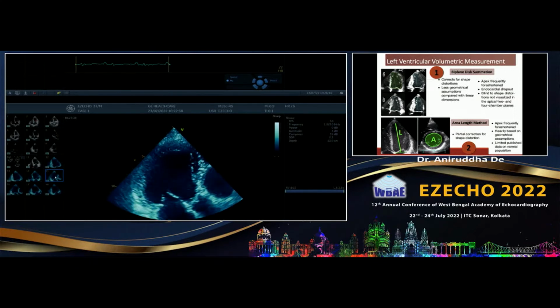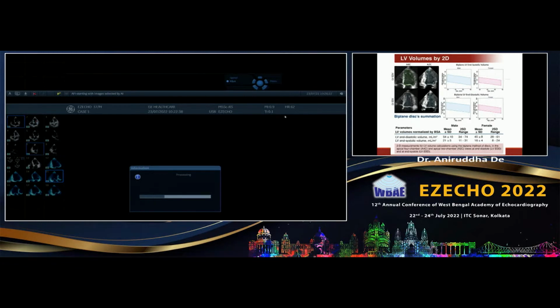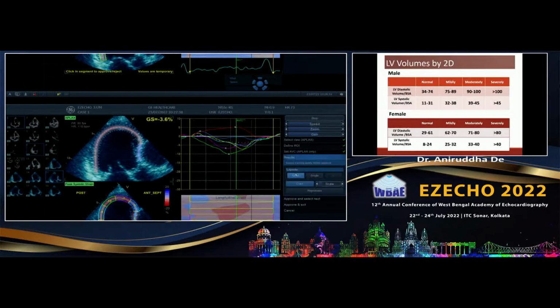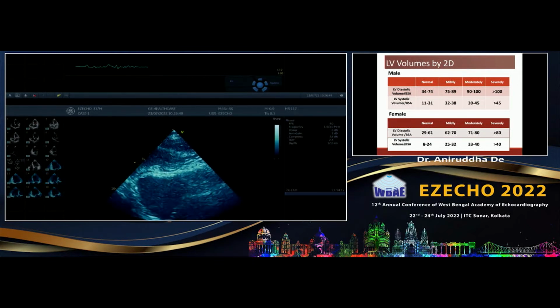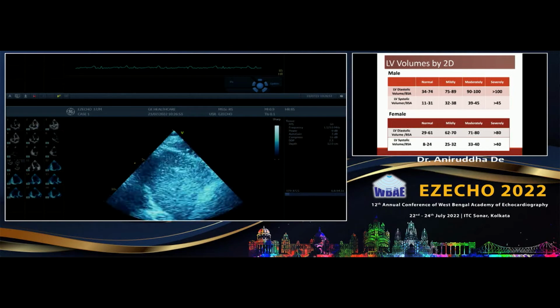Include into the volume. Include. So we go only to the compact myocardium or to the scar tissue. Everything else you include inside the volume. Okay. So many times, especially in patients with COPD or thin ribs, I don't get the apical views very well. So can I use a subcostal view to trace this? What are your thoughts? I think the only issue with the subcostal will be that we really don't know whether we are in a pure long axis or not. So it becomes very difficult. So I think apical views are the best.